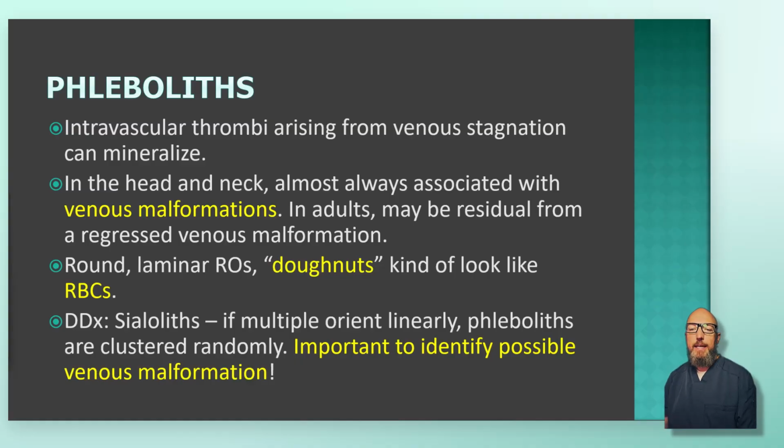All right, and the appearance of these is going to be round and laminar, donut in shape. To me, they kind of look like a micrograph of a red blood cell. You know how it's kind of biconcave in shape, has a very specific appearance. Phleboliths kind of look like that.